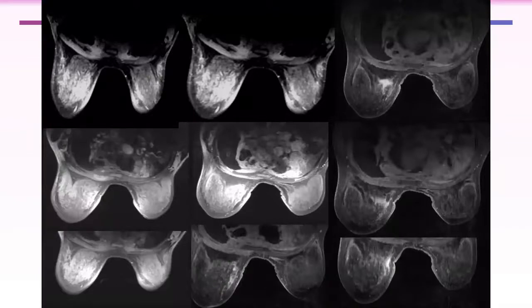So this is the MRI for the same patient. Can you see any abnormality in this? Diffuse breast infiltration, bilateral infiltrative changes in the breast. Especially this non-mass-like enhancement, a segmental heterogeneous non-mass-like enhancement corresponding to the patchy hypoechoic lesion seen on ultrasound. And the breasts are diffusely enlarged and edematous.